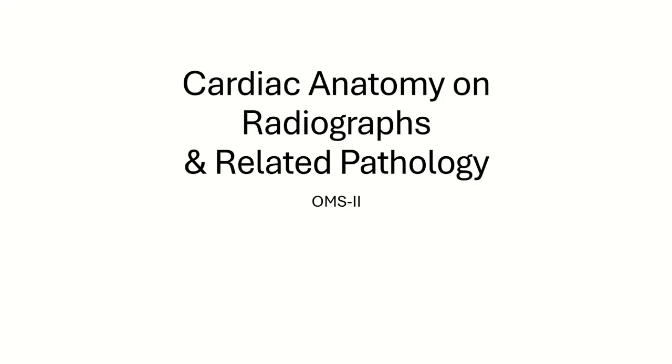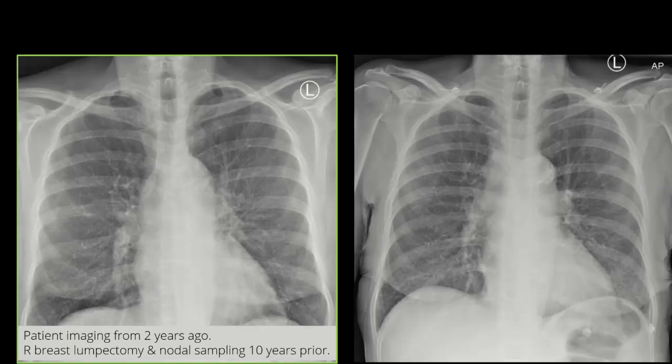Now that you're familiar with the anatomy on chest x-rays, let's look at some pathologies or some changes in the structures you identified. Let's go through some cases. This case is pretty subtle. Here's a patient that we've had a prior chest x-ray from.